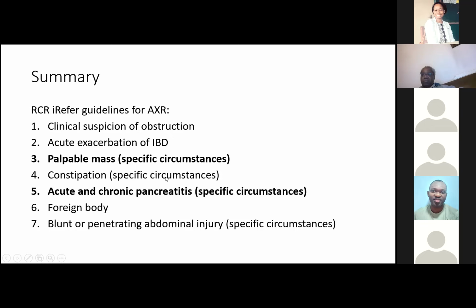I don't think there's a major role for CT here. And I'd always pose a question to the surgeon, what question do you want answered? Because we know that the patient has got a pancolitis or diffuse colitis from the plain film, you have a good idea of how extensive it is. And also, if clinically and radiologically we think it's toxic megacolon, there's no added value to CT. The only thing is whether there is perforation or micro perforation, but is that going to make a difference?